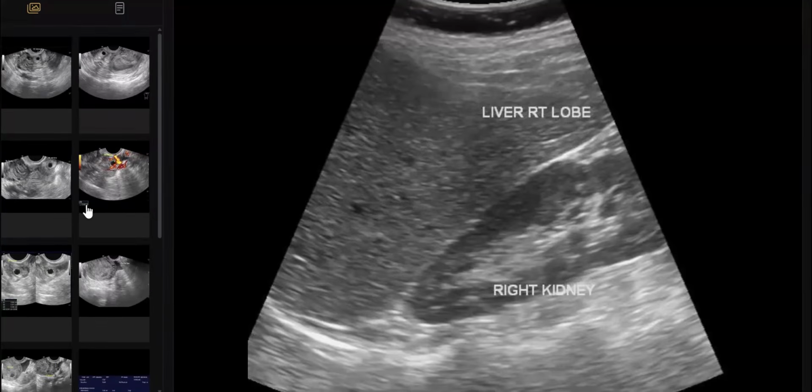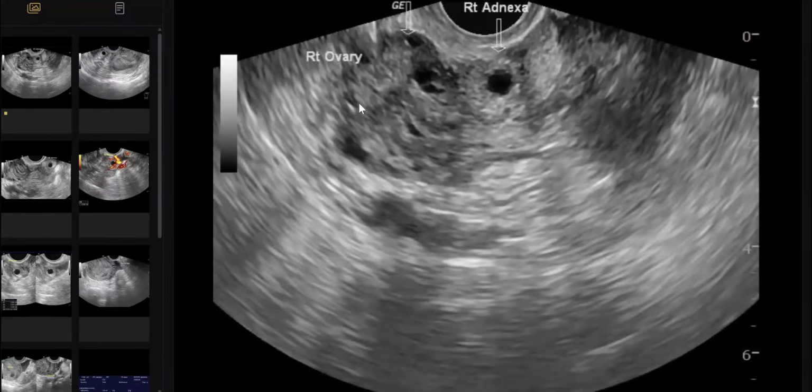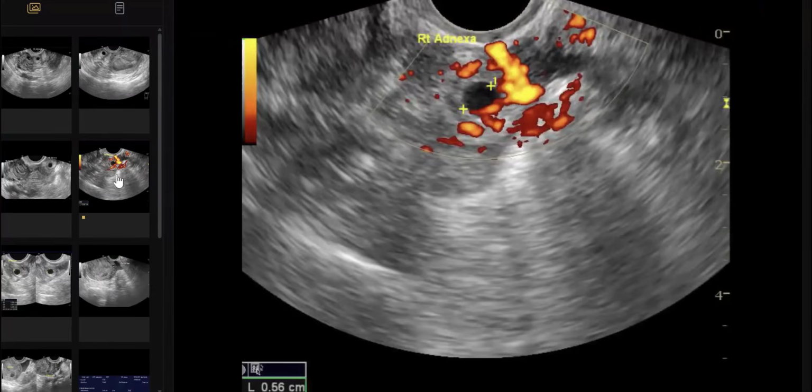We completed the study, abdominal and pelvic, and we see this structure. You see here the ovary and the extra-ovarian cystic lesion with thick wall and hyperechoic wall. It's a tubal, no claw sign. And when we do a Doppler, we have something like ring of fire. So this case, of course, I will correlate with beta subunit, which is positive, disturbed ectopic pregnancy, or just ectopic.